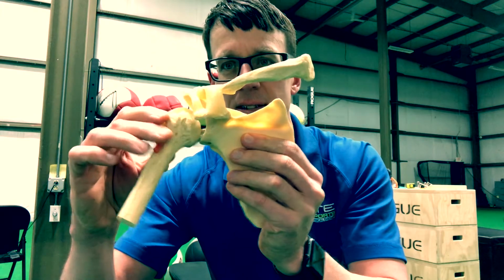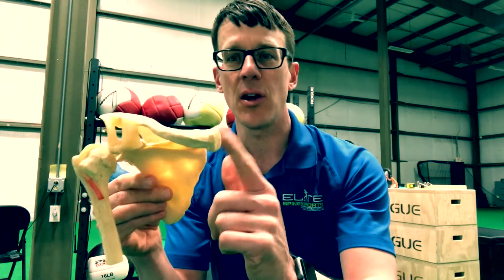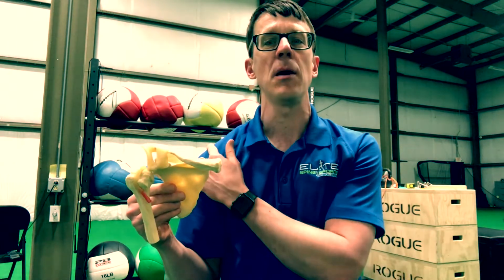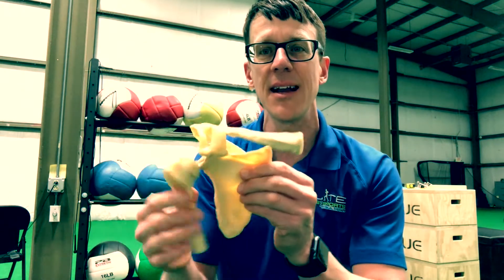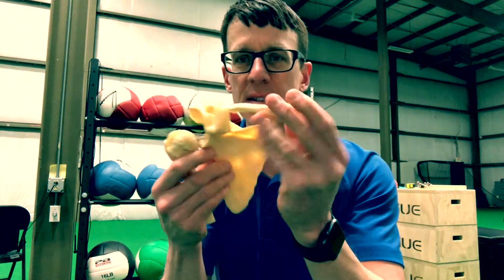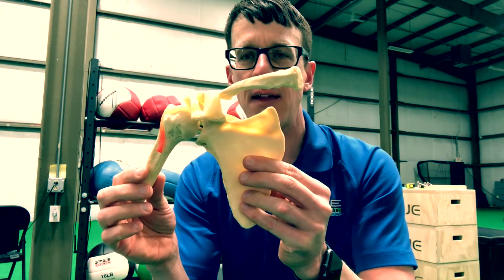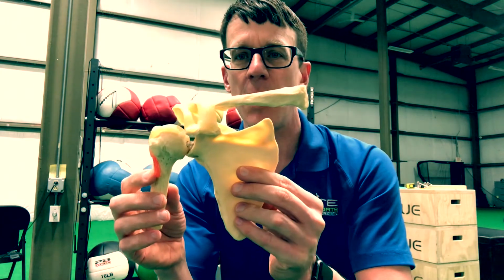That's what we think of when it's the shoulder, but if you think about it, this is the shoulder. This is your collarbone. It sits right in my sternum right there. You can see that little bump there. You can see this bump outside here. That's my acromion and where my clavicle meets that. So that in the back is my scapula. So those are the bony parts of the shoulder, and they'll briefly talk about that on the MRI. What they're really looking at is the soft tissue on the MRI, and they'll comment a lot on that.